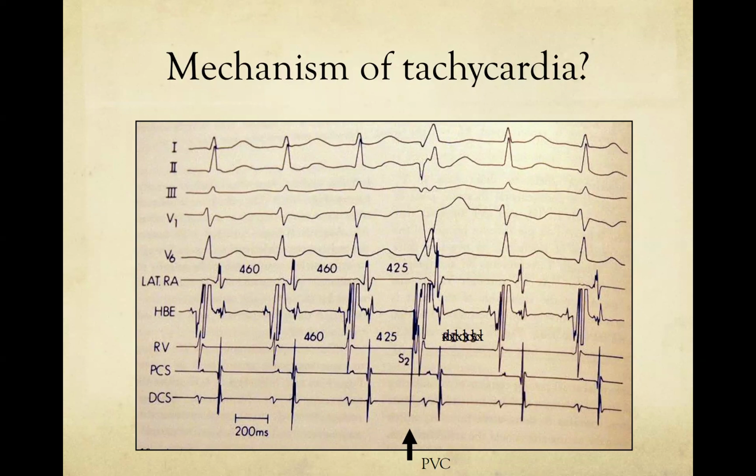Is that a fast or a slow tachycardia for an SVT? I would think that is pretty slow. Pretty slow, right? It's like a heart rate of about 130 or 135 beats per minute. So does that point you, just using what we know about AVNRT versus orthodromic reentry, does that give you any directionality in terms of your thought process?